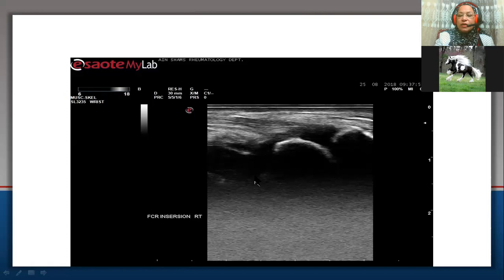So please don't miss this bone irregularity, like that which was present at the insertion of the flexor carpi radialis tendon, which may point to the presence of previous fracture and malunion in this patient. Please don't miss this.